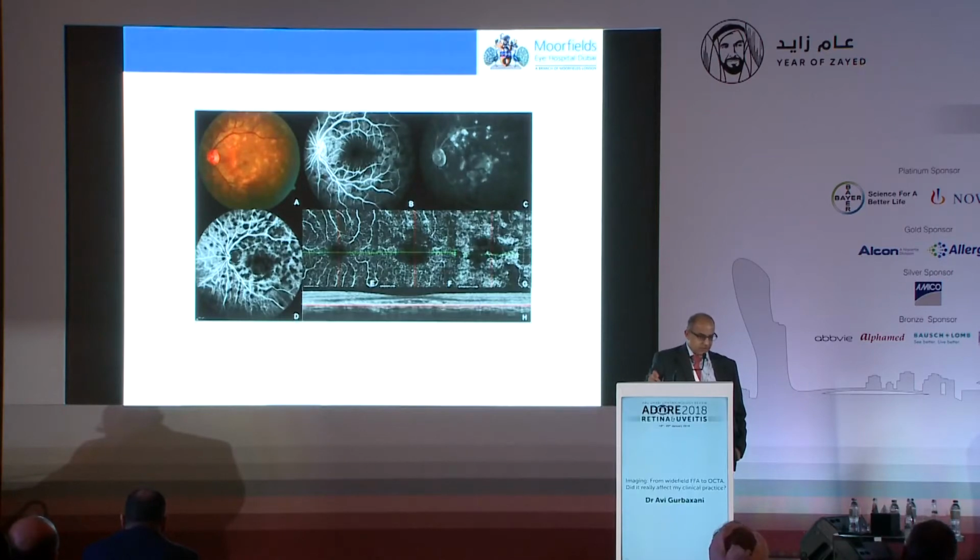This patient with AMPPE, also you can see that there's a stasis in the flow, and because the OCT angiogram relies on blood flow, you can see that any condition where the flow is impaired, you will get corresponding changes in the OCT angiogram.